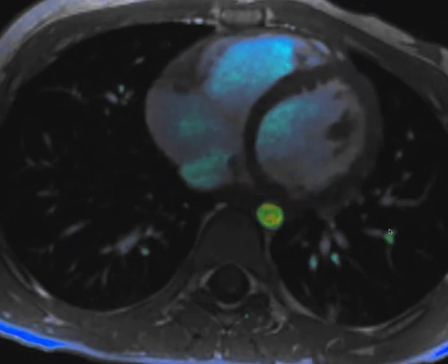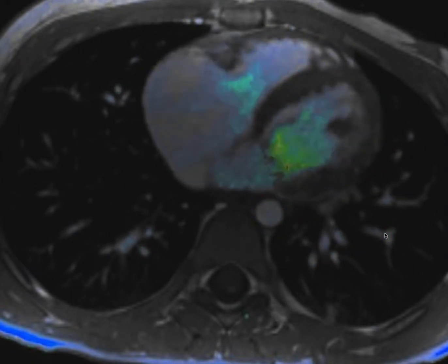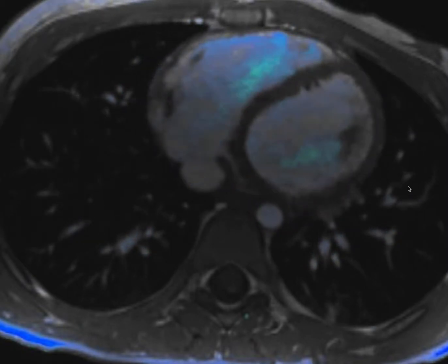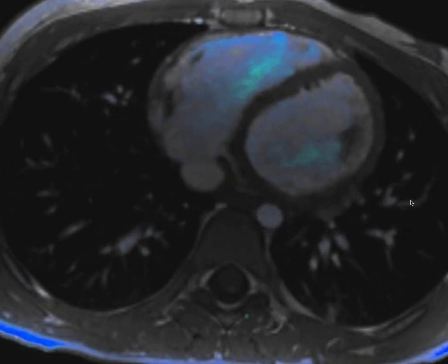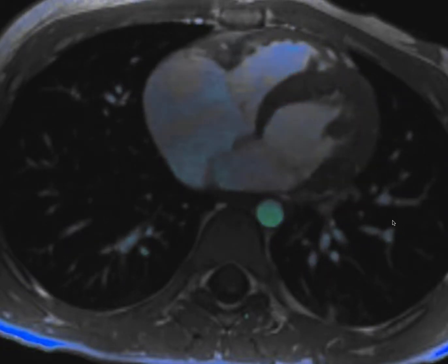I will now cover cardiac anatomy. This is a Cine MRI data set. I'm showing it to you in the axial plane, although it's a volumetric data set. So obviously here you can see the heart in the center of the screen beating away. I will follow the course of blood systematically through the cardiovascular system to highlight the anatomy.